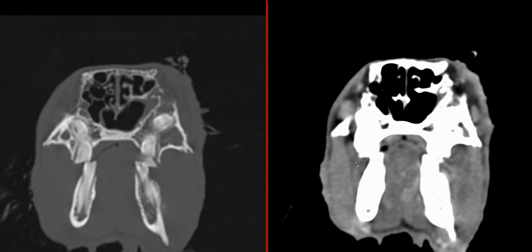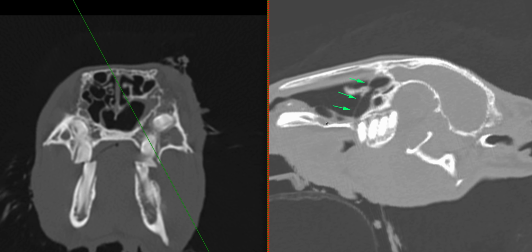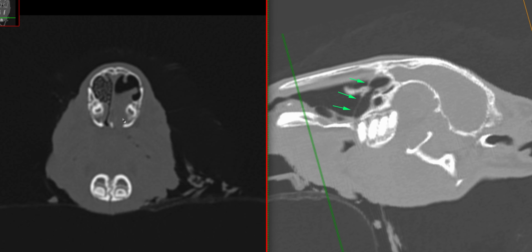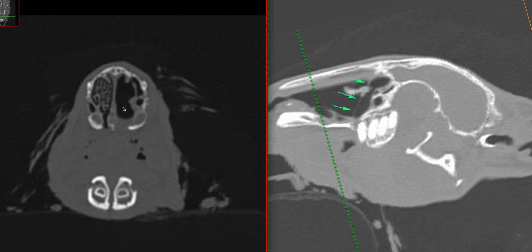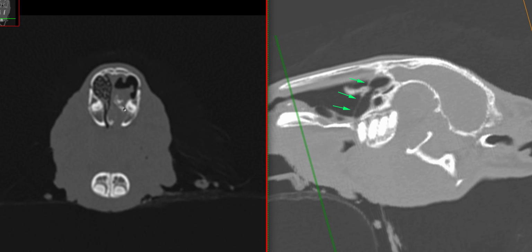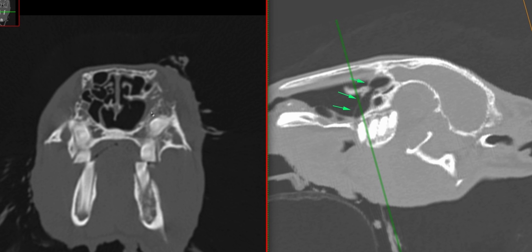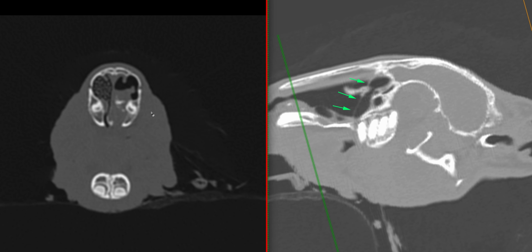On a 3D reconstruction, it looks like something like this. So this is probably a very thin linear foreign body, and the mineralized structure we saw rostrally could be a mineralized granuloma, another foreign body, or a dystrophic mineralization. But the bottom line is that there is a foreign body and a foreign body rhinitis in this rabbit, which is debatably important for the clinical history we have been provided with, but it's important to report on because it may prompt some further therapeutic steps.